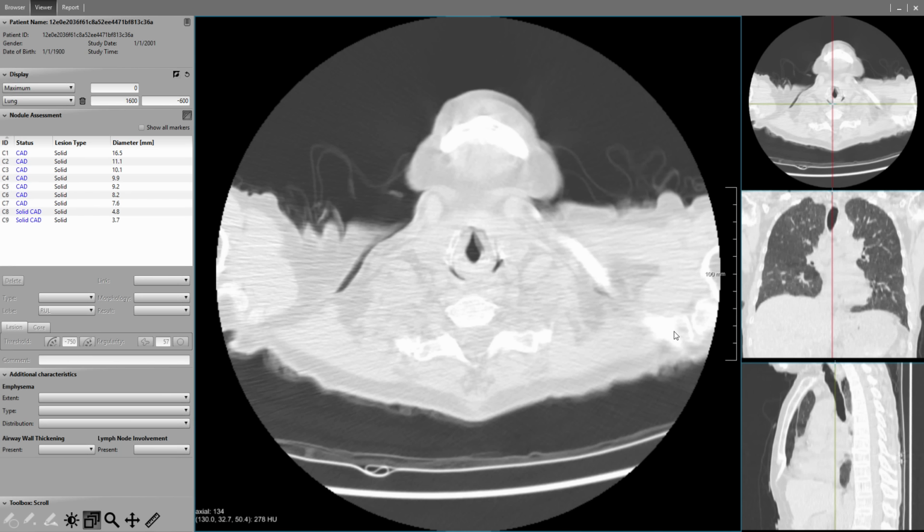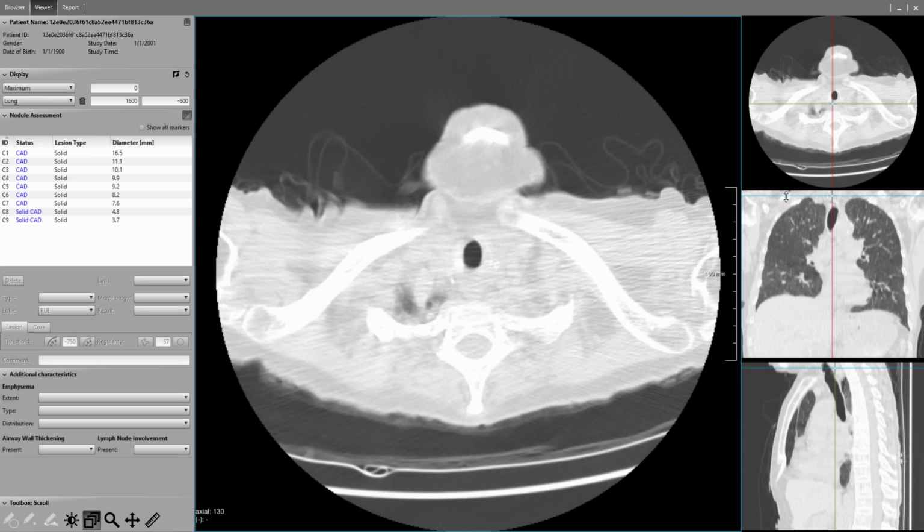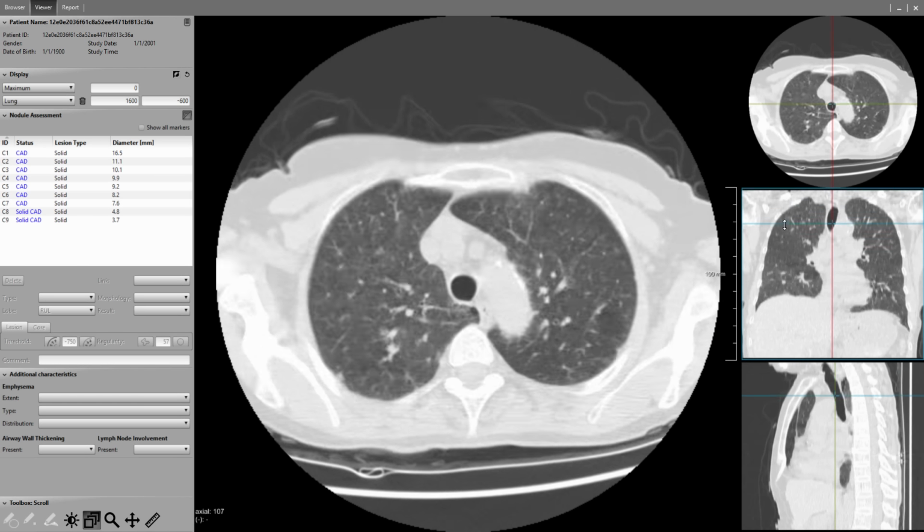Welcome. I'd like to show some CT scans from the Data Science Bowl 2017. These are CT scans from the training set, and we know that for this particular CT scan this is a lung cancer case. So that means this subject was diagnosed with lung cancer within 1 year of the scan. And that means that it's likely that we can see something in this scan that is suspicious for being lung cancer. So what I'm doing is I'm scrolling through the scan.